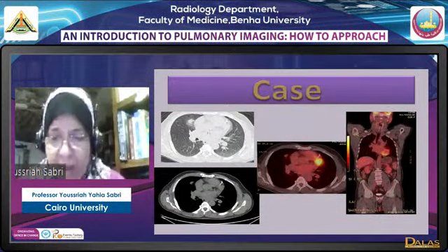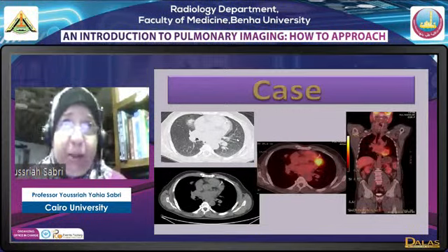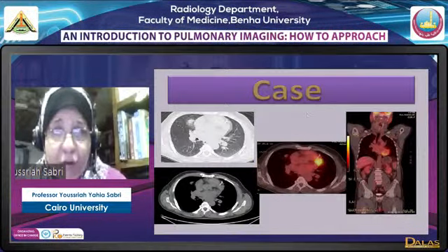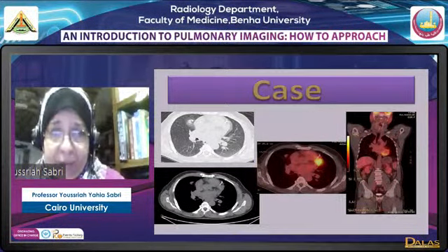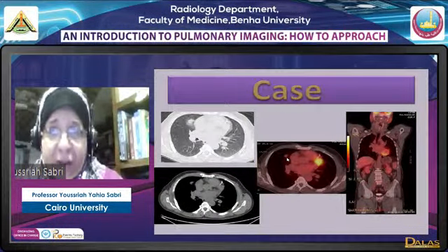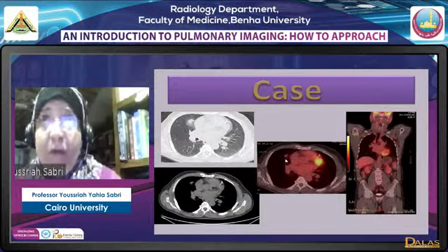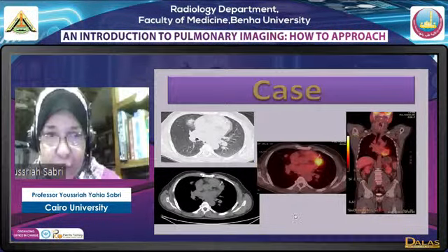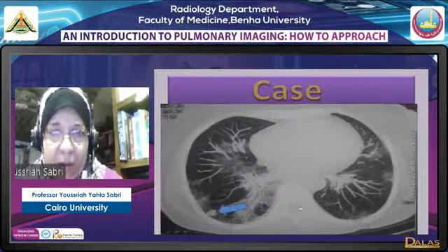Well, actually, if it was inflammatory, there would have been some uptake. No uptake means scarring. No, this is not the appearance of scarring, but there is a lesion, subsolid, which didn't take any tracer in the PET CT. This is very suggestive of adenocarcinoma in situ, and the case was proved to be an adenocarcinoma in situ.